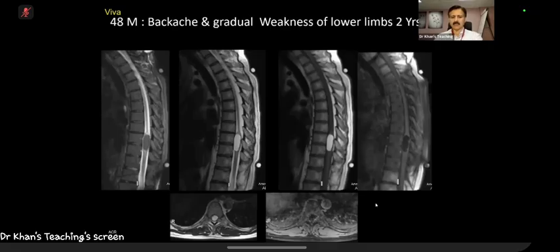And if there is a ruptured dermoid, it causes chemical meningitis, and then prognosis is not very good. And so a ruptured dermoid in the cord or in the spine can present upstairs in the brain, and I've shown you cases in the past also where there is something in the CSF space on a CT scan which will be darker than CSF or on an MR, and then you will ask for a cord sequence to rule out a ruptured dermoid.